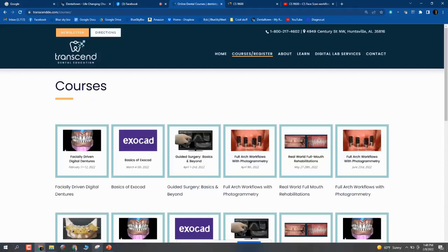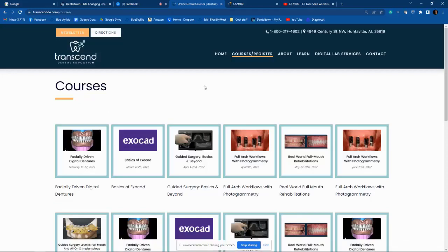And so this lady that I'm going to be showing you today, that was a 2 appointment denture essentially.